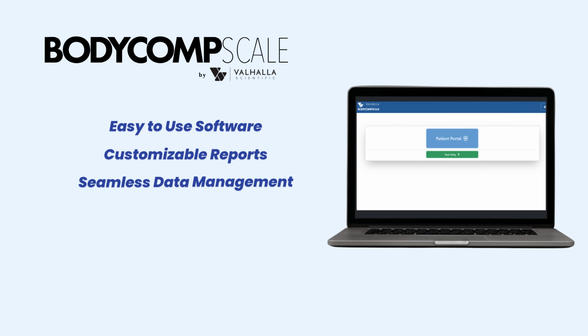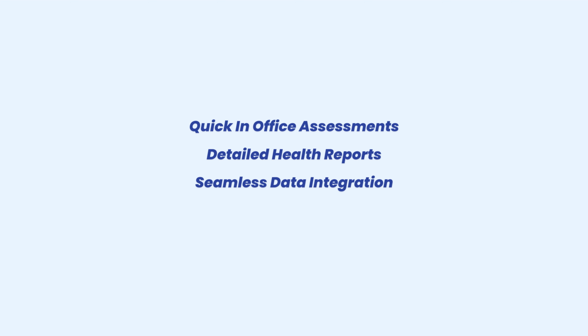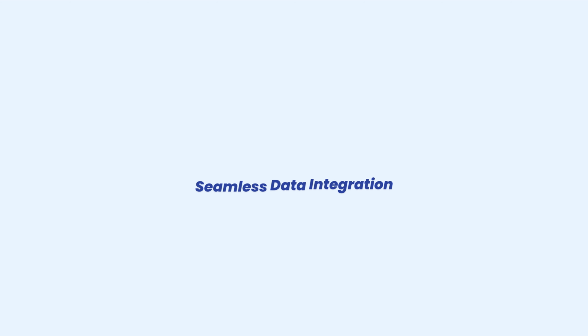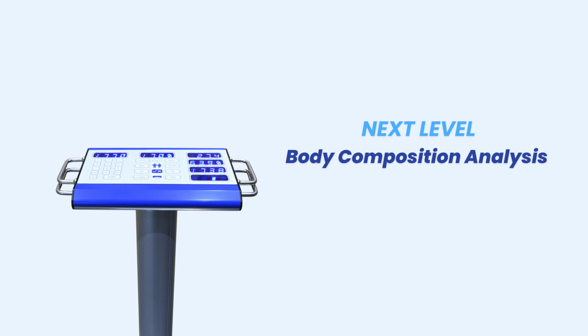With the easy-to-use software, customizable reports, and seamless data management, it empowers medical professionals, weight loss clinics, and wellness centers to track progress, engage patients, and enhance care. Whether you need quick in-office assessments, detailed health reports, or seamless data integration, the BodyCompScale streamlines the process, allowing you to focus on what matters most: your patient's health and success. Experience the next level of body composition analysis today.